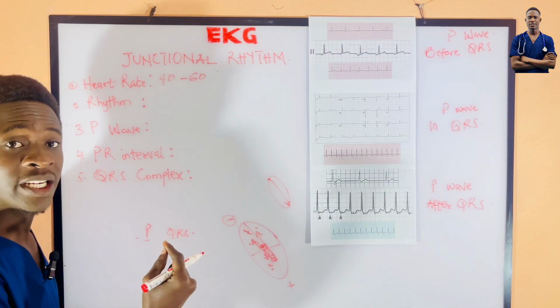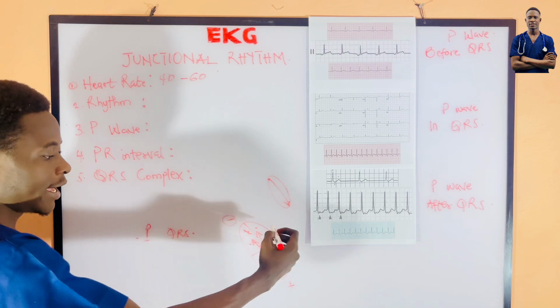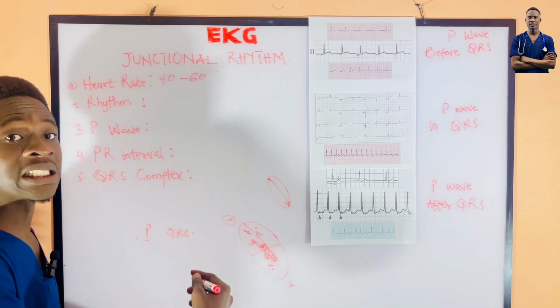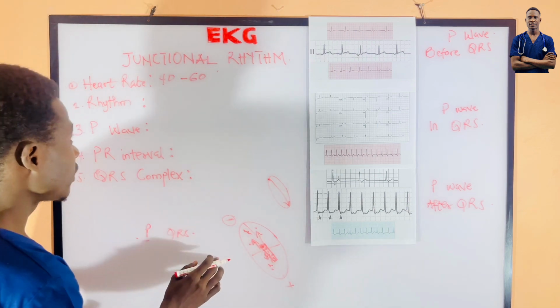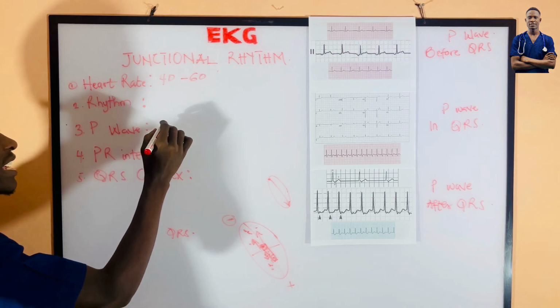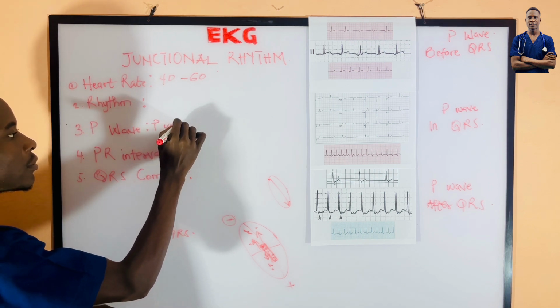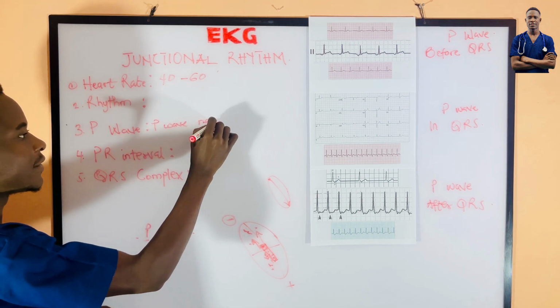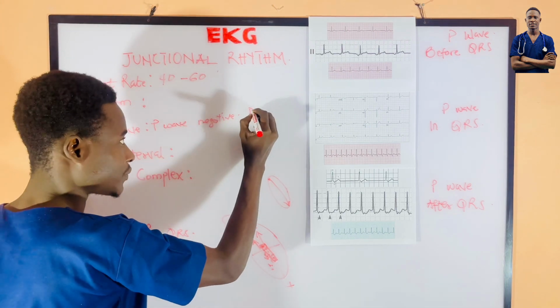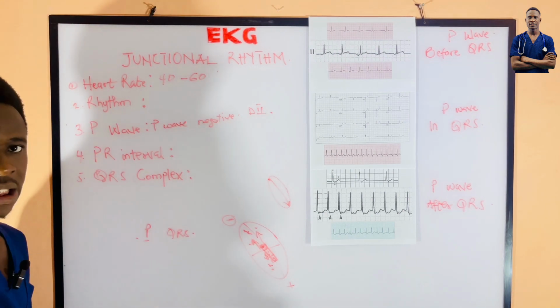a negative reading. So here the P wave generating over here, or the atrial contraction over here, is being represented by a P negative reading. So here we get a P wave. We get P wave being negative. So P wave negative. Are we clear with it? On the D1. Sorry, on the D2. So P wave negative on the D2.